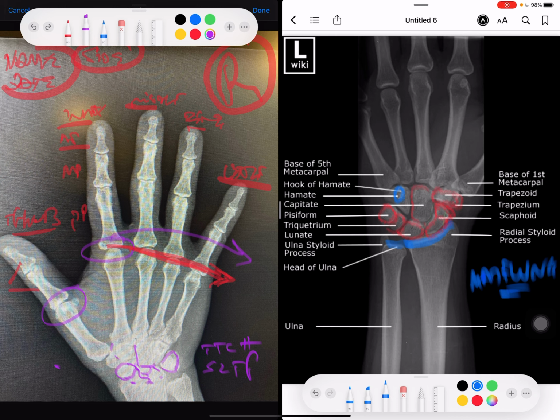So you can see the hamate, the hook. Okay. So here again, always look for basal arthritis, dislocations of the thumb, of the finger. The bones are outlined. In rheumatoid arthritis, there won't be any bone spurs. There'll be bone cysts.